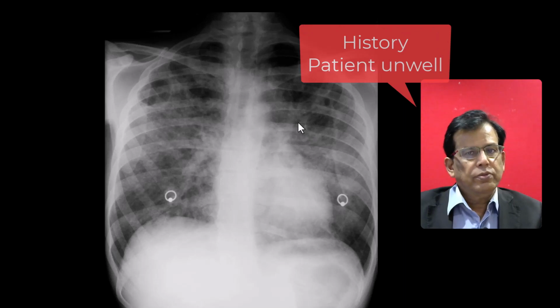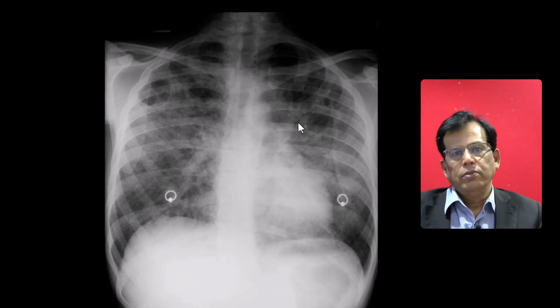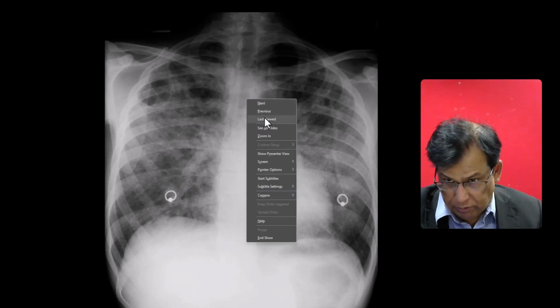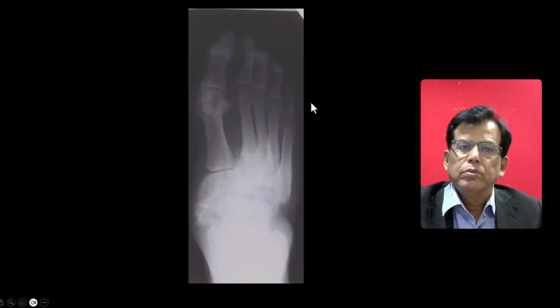So the frontal radiograph of the skeletally mature patient shows widespread areas of airspace opacities in both hemithorax, and within those I can see a few cystic lucencies predominantly in the right upper and left upper and middle lobe.